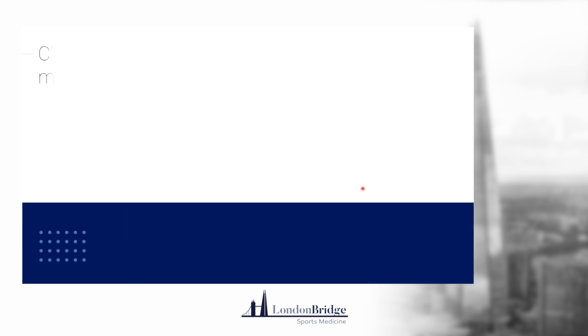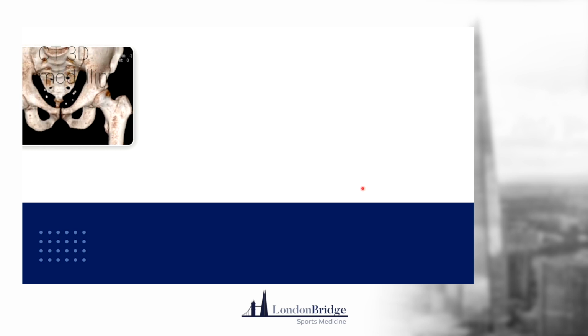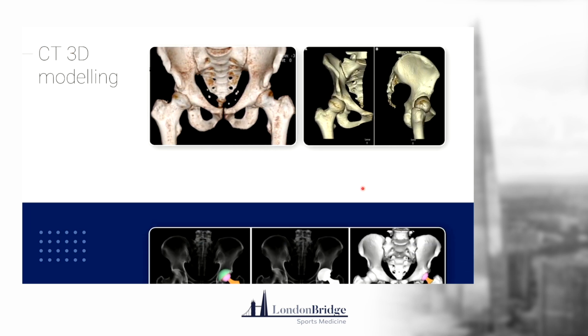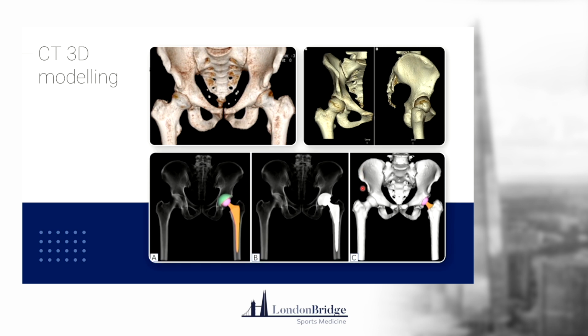As we mentioned, 3D planning. Very useful for, again, our orthopedic colleagues, but I think sometimes they can give you nice 3D conceptions, particularly around acetabular overcoverage or Perthes, for example, about how it's affecting angles and things. So very useful.